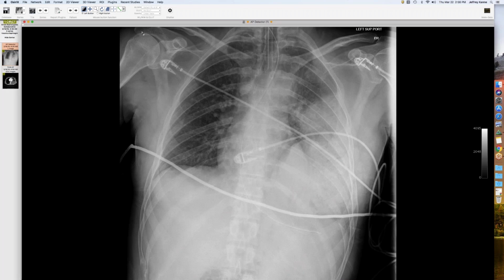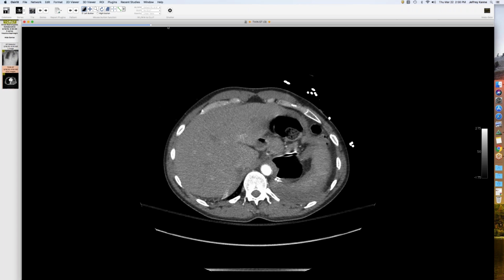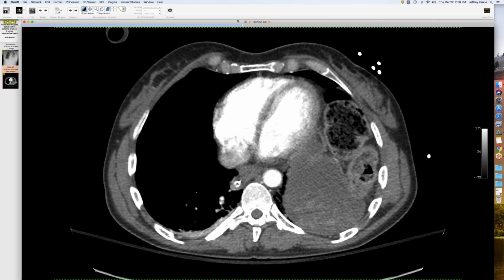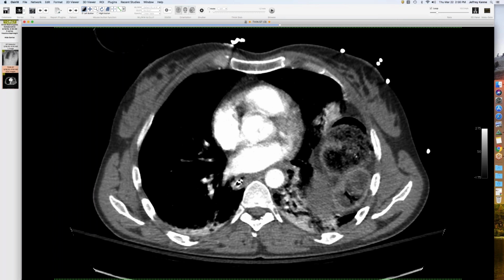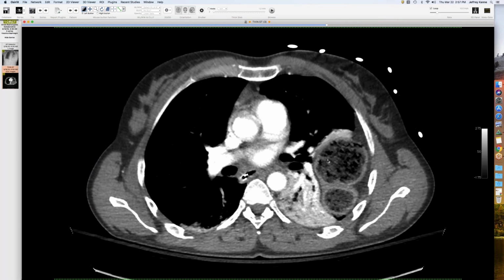Okay. Ouch. All right, and this came 4 days before, so this is more of a traditional one, but this is a great one with the classic findings. So you have abnormal diaphragmatic contour, you have the contusion, patient clearly severely injured. This patient was ejected from a car as well, but this is probably the best example of a dependent viscera sign I've ever seen. You've got gastric fundus here up against the posterior wall of the chest, a little colon coming way up here, abnormal breath sounds for sure, atelectatic lung.